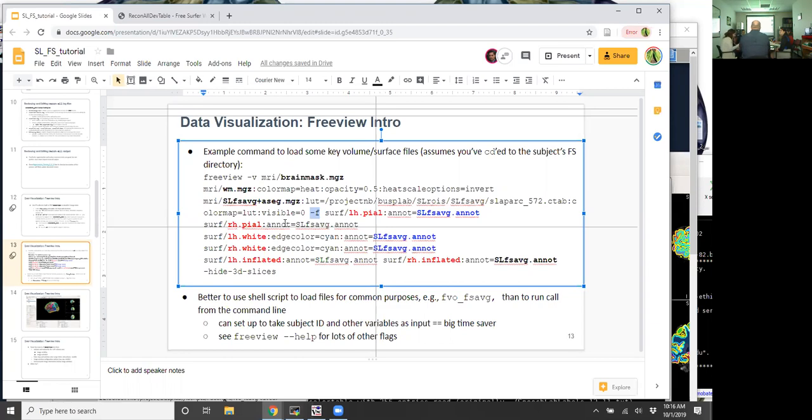And you could think of it as just, Freesurfer does this stuff by default. I'll explain one little wrinkle here that we use as a kind of a cheat to make it easier for us to quickly label the brains and make changes to our labeling system. So it's a little bit different than what Freesurfer does in its normal pipeline. But Freesurfer is doing the same thing.